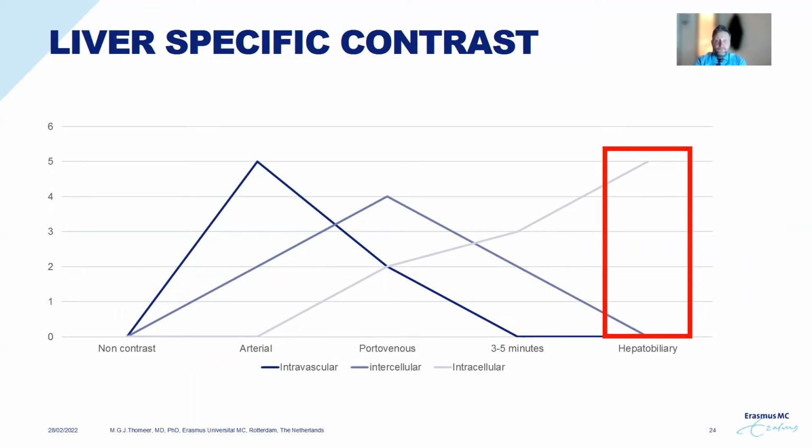These tumors are, as stated before, the HCC or hepatocellular carcinoma, the liver adenoma, and the FNH. However, apparently only FNH shows strong uptake as much as the surrounding liver. In very rare circumstances, also liver adenoma and HCC can show strong uptake. We will discuss this in a later session.